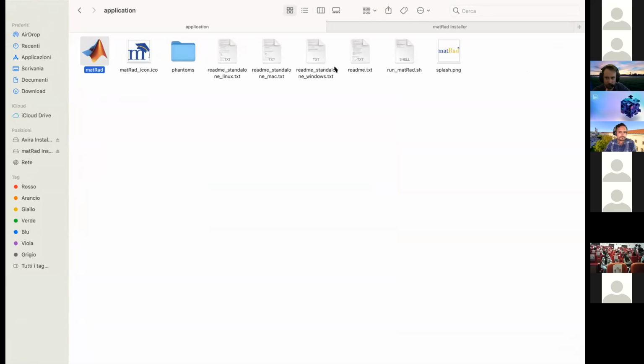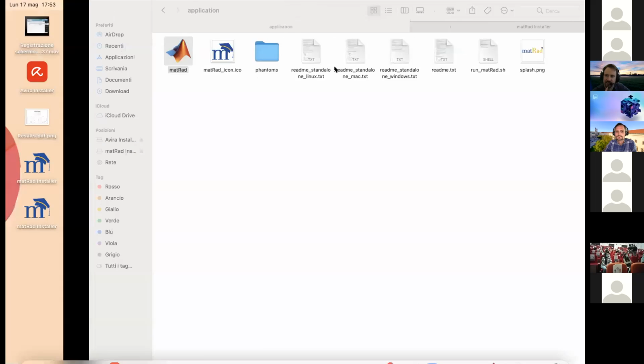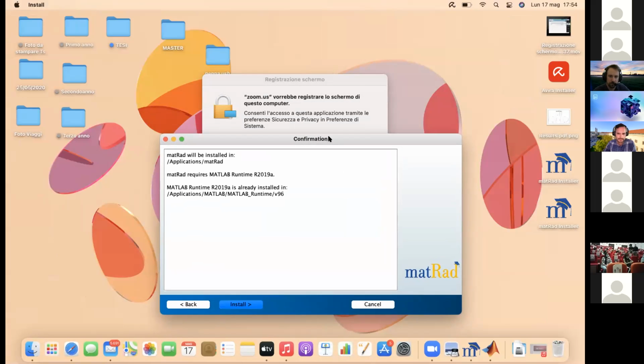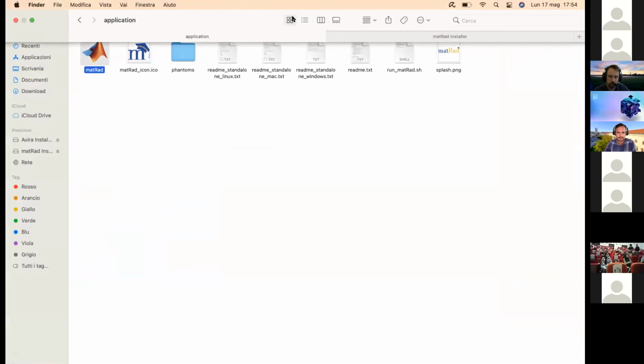That's usually one of the reasons why it fails, because of this developer certification and whatsoever, which we don't bother to get. You can basically cancel this installation here because you already installed it correctly. Here, you can click on cancel. Thank you a lot.